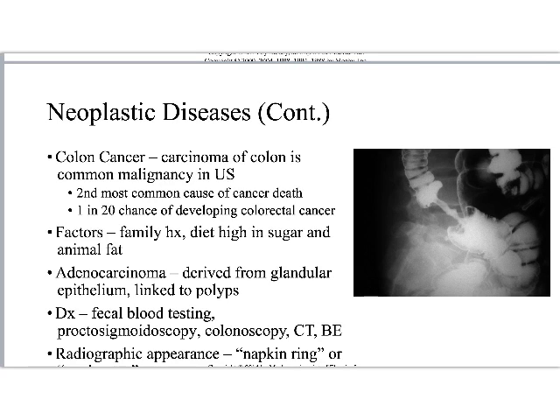Colon cancer. All right, this one's probably the biggest takeaway. Look, there's another apple core sign, right? So we just had another apple core sign, but where is it? It's not in the stomach. It's in the colon. So the same thing is now going on. Same sign, different place. It's still a tumor. The tumor is strangulating this thing and wrapped around the colon now, right?